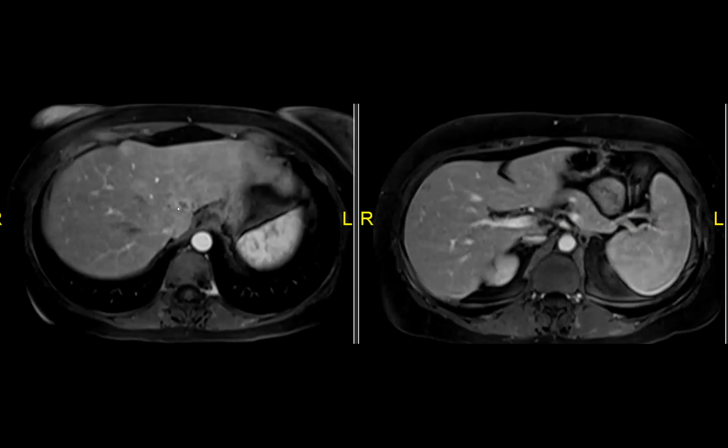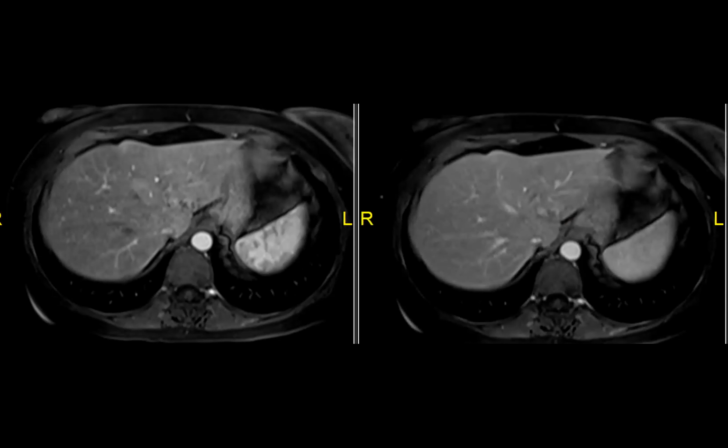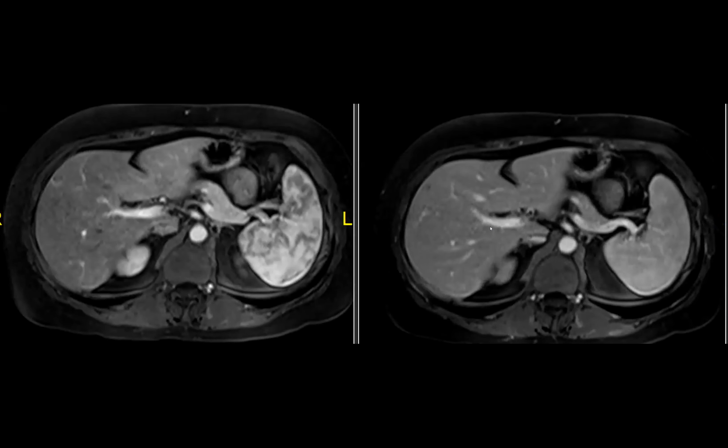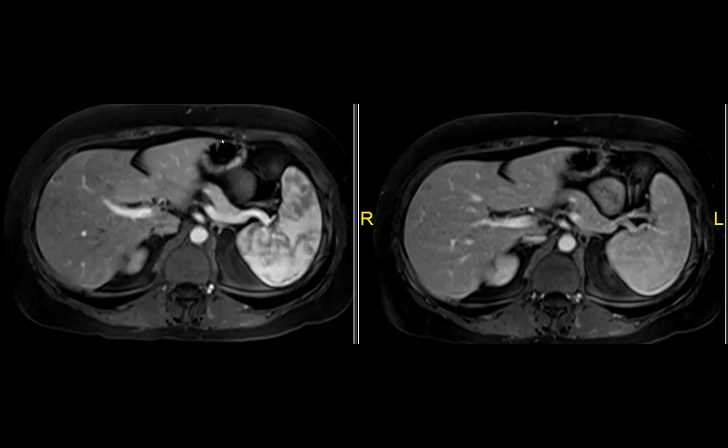I can see why the hemangioma diagnosis came into place, right? You can kind of make a case, maybe this is discontinuous, but when you look later on, they're not really expanding, these little areas of enhancement. T2 was not quite as bright as necessary, but look at the other ones. Maybe I was looking at the wrong one. Okay, wait a second. Look at the other ones. Right? Look at these. They're not. This is not hemangioma. You agree? Yeah, none of them are classic.